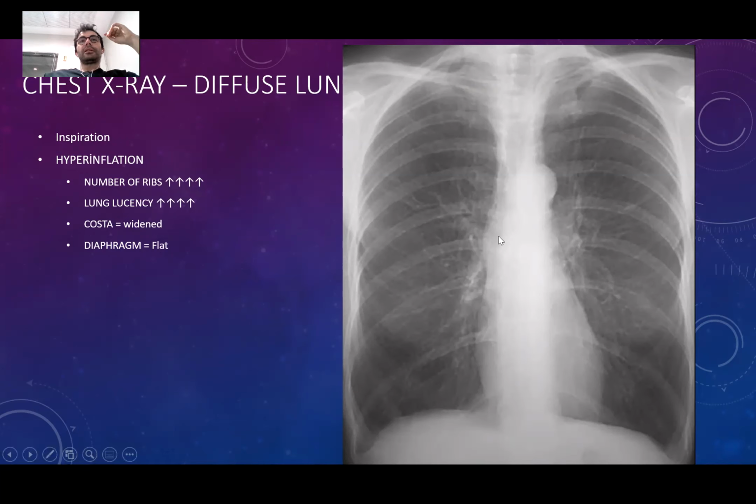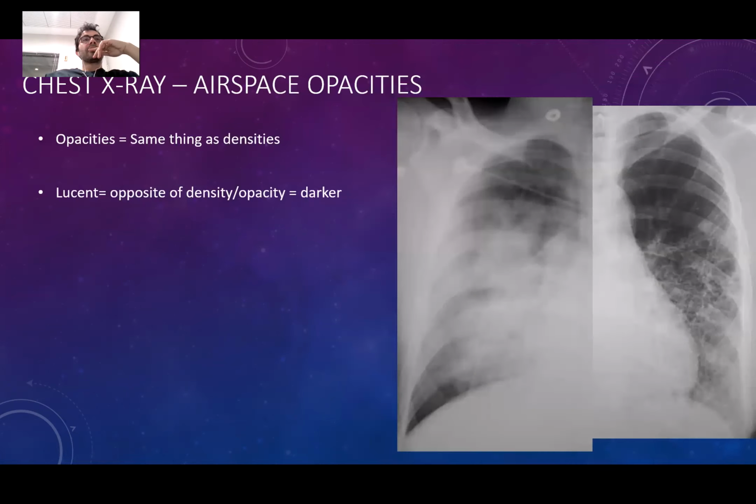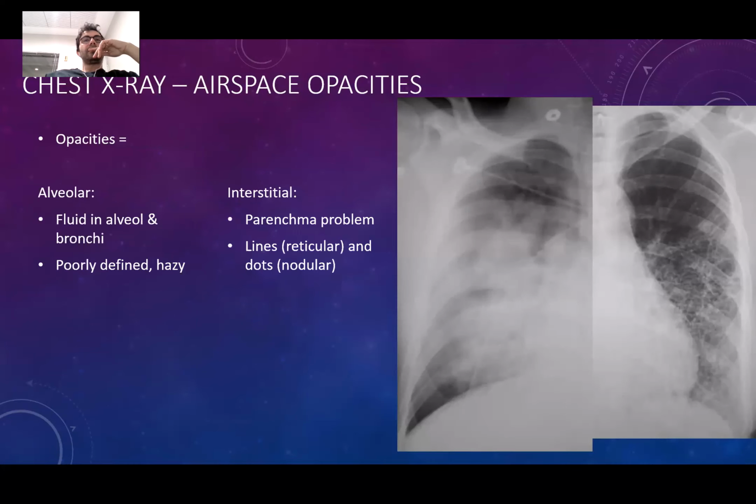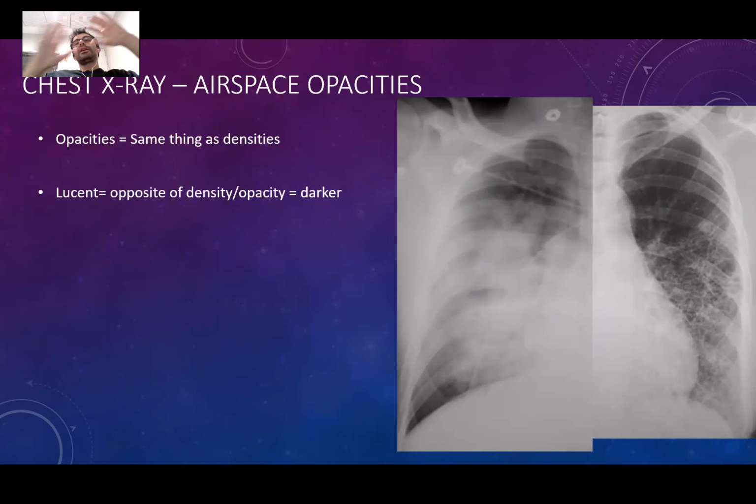This is a case of chronic obstructive lung disease. These are the important findings you should look for. These are usually very thin patients, and you can see cigarettes in their pockets, usually total smokers. And coming from that, now I think we have finished everything except the lungs, as you have realized.